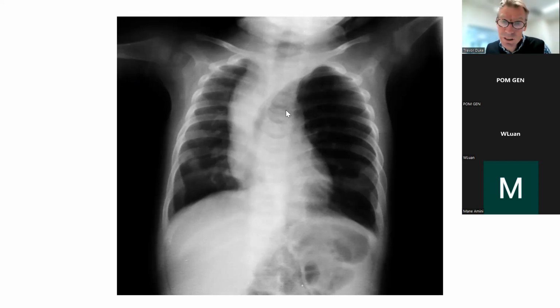Did someone say a foreign body? Yeah, that's what this is. This was a foreign body, and a foreign body that had gone just down the left main bronchus. Now, foreign bodies usually go down the right main bronchus, but on this occasion, the foreign body went down the left main bronchus and caused what was like a ball valve obstruction to the left lung.